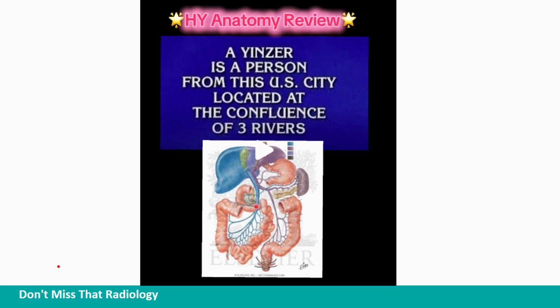But it makes me think of the portal vein anatomy. We're gonna have our portal vein going hepatopetally towards the liver, hopefully. That's normal. But what is it made of? Well, we are gonna have the splenic vein. Hey, we just saw that with our lesser sac and our pancreatic anatomy. Yeah, good memory on that. Go back, take a look at that. So there's our pancreas there.